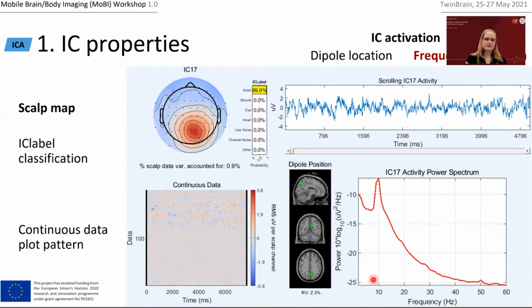If you have a brain activity source reflected in your independent component, you usually have an alpha peak around 10 to 12 or 8 to 12, somewhere there. This one is really pronounced, but sometimes it's not that pronounced. And then how this evolves above this 1/f background activity defines different kinds of sources, and we're going to see that later on.